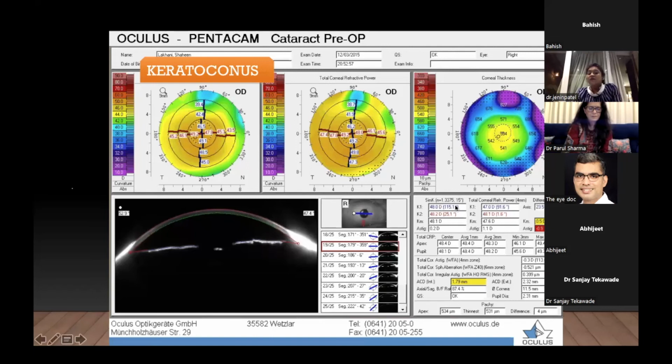So you have values of the anterior corneal curvature, which is telling us that there is no toricity in this patient. But when you look at the total corneal refractive power, it is telling us that there is an astigmatism of 1.1. And when we look at the difference between the two, it is giving us a difference of 23.5 degrees. So this particular patient I am not going to treat with a toric IOL because, one, my graph gave me a bimodal peak. Second, my anterior surface is only showing me 0.2, with 1.1 on the posterior surface, which is something I definitely want to be cautious about.